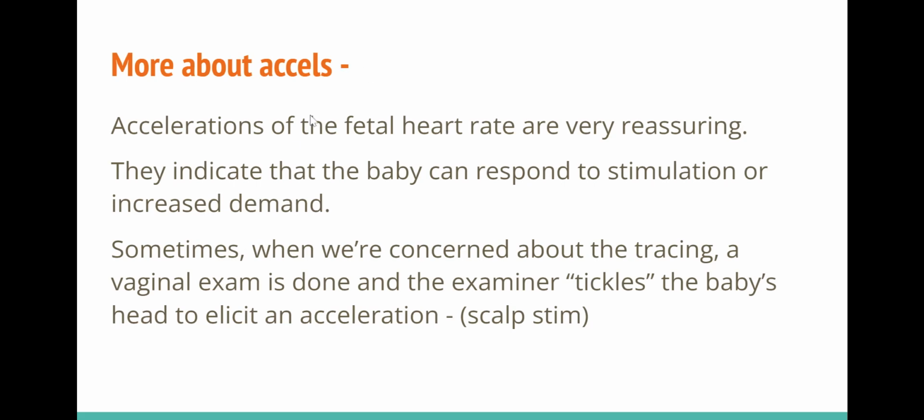So more about accels. Accelerations of the fetal heart rate are very reassuring. We love them. They indicate the baby can respond to stimulation or increased demand. Sometimes if we're concerned about the tracing, somebody will do a vaginal exam and tickle the baby's head a little bit and see if that baby has an accel in response to that. That's called scalp stim. It's an assessment. You try not to do it when they're in a decel, but if they've got minimal variability and you're worried about them, you can tickle the head and see if they respond to it.